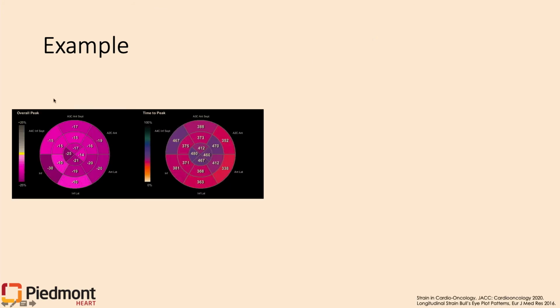Finally, make sure you include a clip of the bullseye plot, and depending on the color scheme offered by the vendor, it may be easier or more challenging to look for the pattern recognitions that you can see in certain cardiomyopathies, but I would still include the bullseye plot. We can still look at the numbers and see if there's any pattern that looks obvious to us.